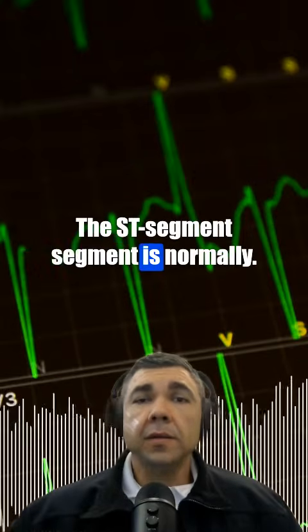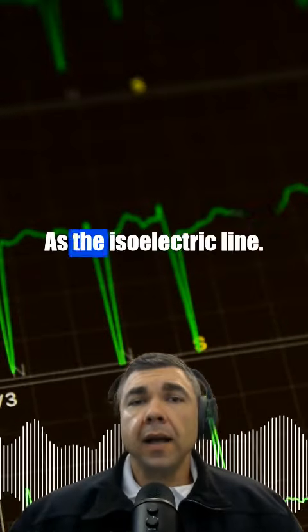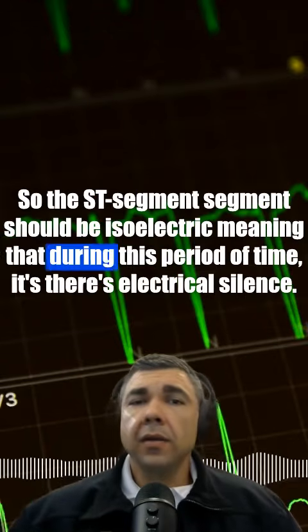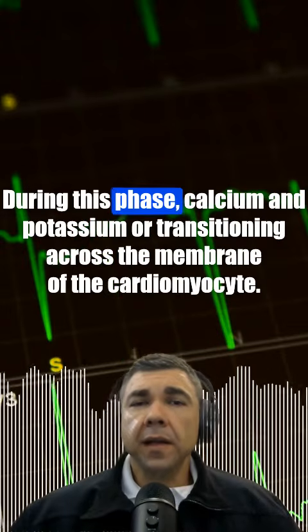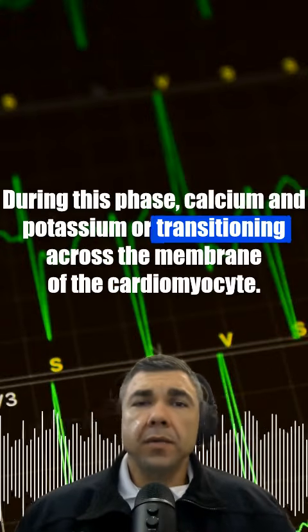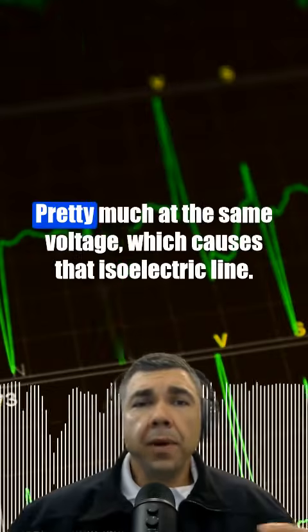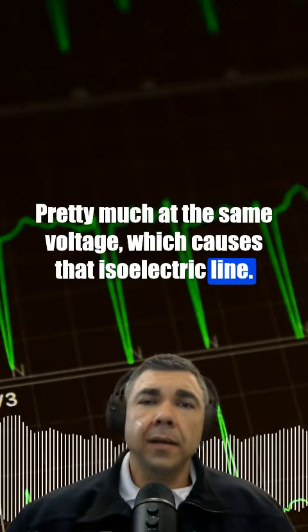The ST segment is normally at the same level as the isoelectric line. So the ST segment should be isoelectric, meaning that during this period of time, there's electrical silence. During this phase, calcium and potassium are transitioning across the membrane of the cardiomyocyte pretty much at the same voltage, which causes that isoelectric line.